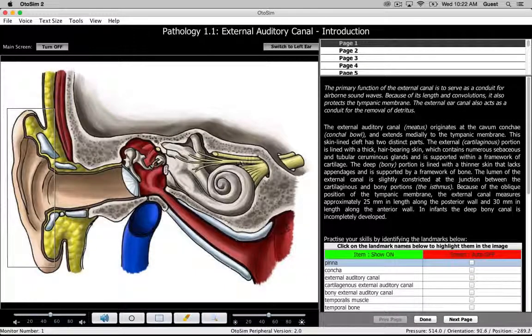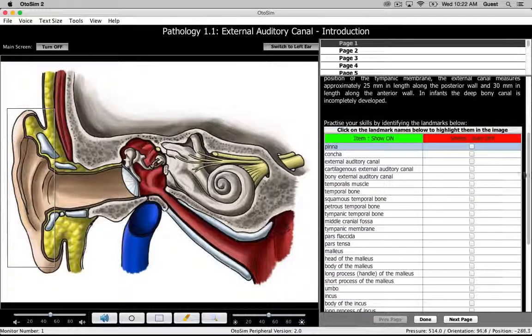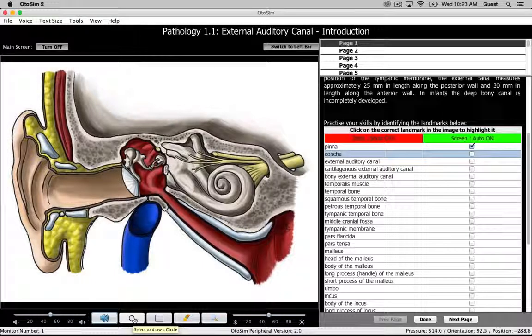In the introduction section now, we will repeat some of the things that we learned in the first part with respect to our anatomical knowledge. You'll see again when these two charts appear that we can identify the structures on the main screen. This first picture is not to be used in the simulator, but again to review some of the relevant anatomy. This is the teaching ability of an instructor to the student. I can actually annotate certain structures.